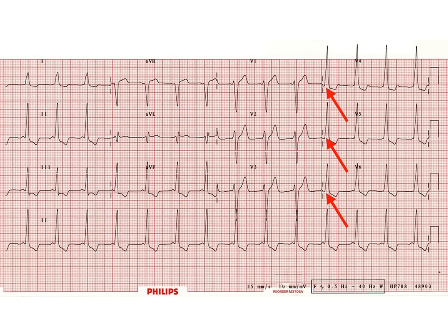And if you really put on your bifocals and zoom in here, you can see that upslanting portion of the QRS. Now, in real life, this is a pretty rare disease. But on USMLE and COMLEX, it's pretty high yield because that subtle finding, that upslanting of the QRS, should tip you off that this is WPW syndrome. And then from there, they can go in a whole bunch of different directions by asking you things about pathophysiology, about the treatment for Wolff-Parkinson-White syndrome.